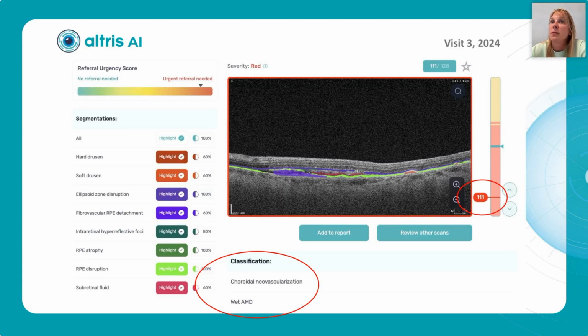The most amazing thing in this situation is that the visual acuity of this patient having GA in the center was extremely low, and the patient has had no additional complaints.